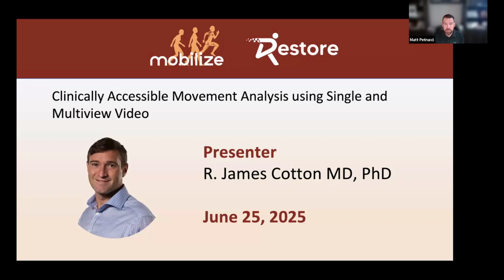Research talk. In this portion of the webinar, our speaker James Cotton will lead an interactive tutorial on fitting biomechanics from a sample monocular video using an end-to-end optimization-based approach.